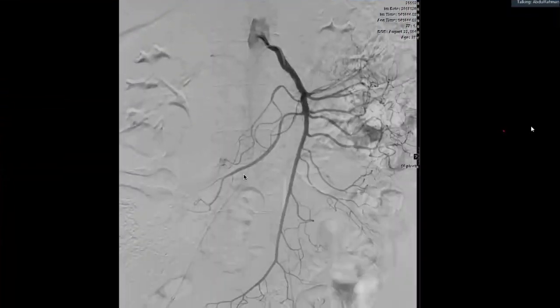Whenever you get a picture like this, remember this is a selective angiogram of whatever artery you decide to call it. So selective DSA, spot image, or angiogram selective. You can see a catheter has been placed into this artery and contrast has been given to delineate only this artery and nothing else. You can see some reflux here that goes back into the aorta. This is normal. This is artifact. I wouldn't worry about this.